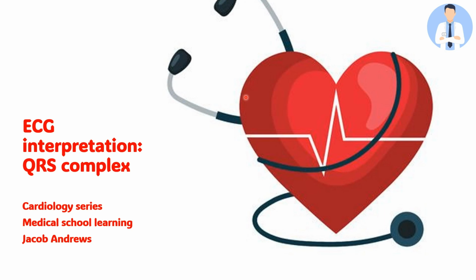Welcome to part 9 of this cardiology series, where today we're going to be discussing the QRS complex as part of our ECG interpretation. So today we're going to be talking about the components of the QRS complex. We're going to be talking about normal morphology and some pathology too. So with all that being said, let's get straight into the video.